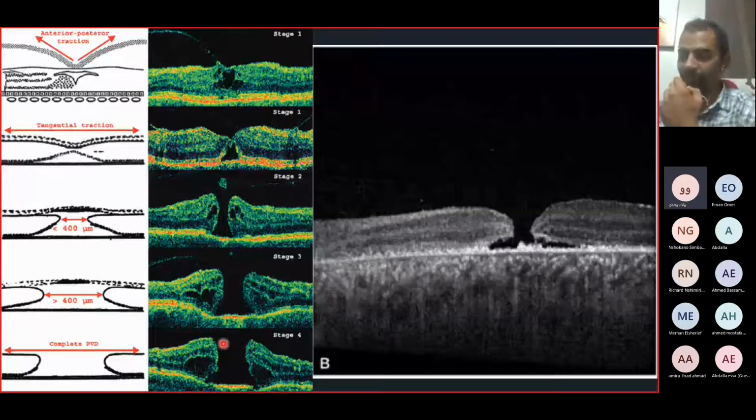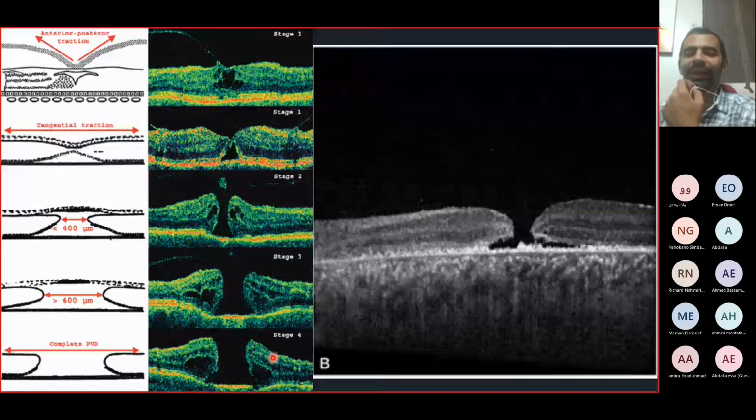That's true, because in fresh macular hole we usually have cystic spaces in the nearby retina, and you have swelling of the edges of the macular hole. So the edges of the macular hole are swollen, while in neglected macular hole, those cystoid spaces usually resolve over time, and the edges of the macular hole will become of normal thickness like here. Which one has better prognosis if you are counseling the patient about surgery? If you have 2 patients, this one and that one, which one will have a better chance of closure after surgery?